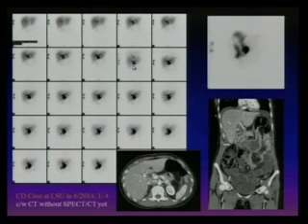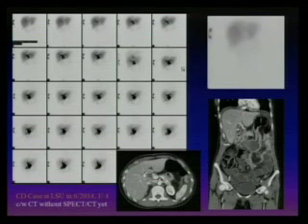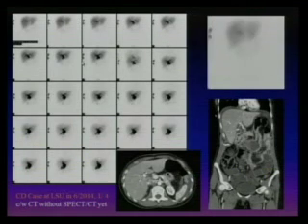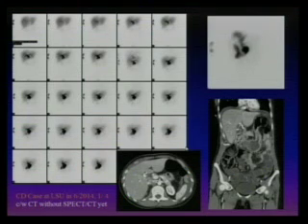I thought, looking at it over here, that was just part of the drawing. Yeah, so when you see here, you get confused. So that's the trick. No matter if it's a leak or bleeding, follow the series. Look at the first point where it comes from. So this is in the cystic duct, the remnant of the cystic duct. At that time we didn't have a SPECT CT, but this is CT, and you can see the surgical clips here. And that's the way you tell exactly.